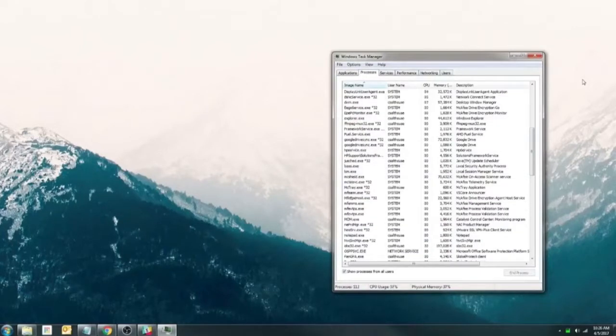Now we are going to relaunch the viewer along with any additional applications, such as the Philips Device Control Center, from the Start menu. This will reload the Dragon application.